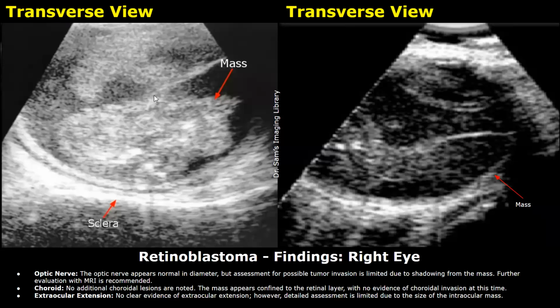No choroidal lesions were noted. The mass appears confined to the retinal layer with no evidence of choroidal invasion at this time. And there is no evidence of extraocular extension. However, detailed assessment is limited due to the size of the intraocular mass.